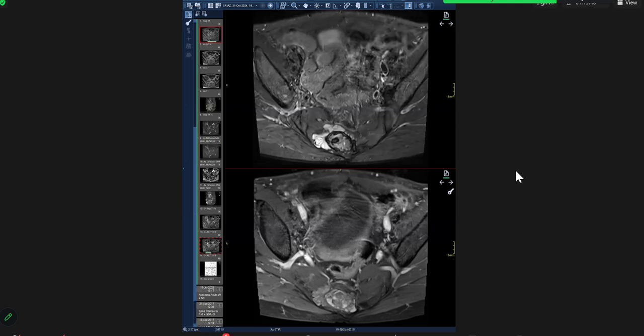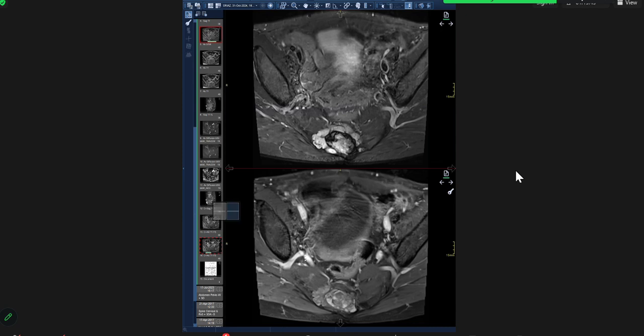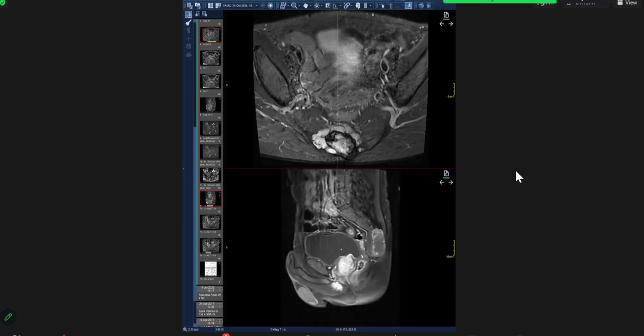There are few tumors that are bright on T2, and this is one of them. So you can easily suggest the diagnosis just from it. So yeah, this is just a companion case for you. I just thought I'd show you this as well.